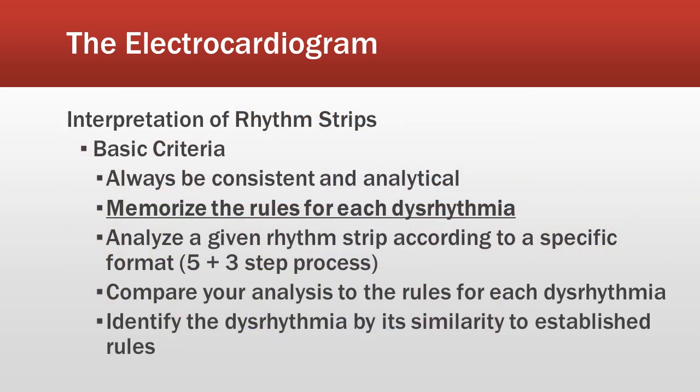Interpretation of these rhythm strips. Any book that teaches you rhythm interpretation tells you to memorize the rules for each rhythm. We will teach you the 5+3 step process for rhythm interpretation.